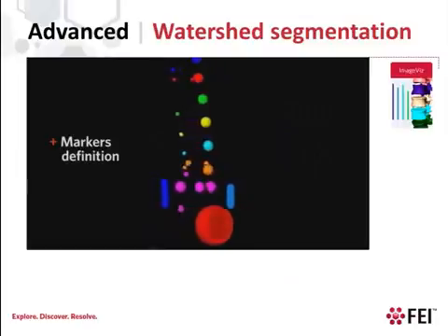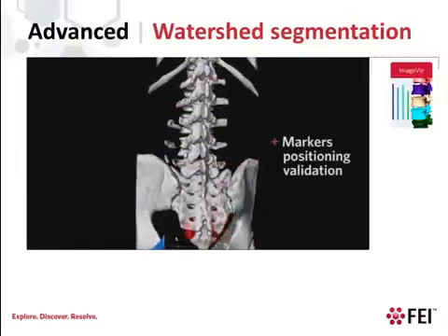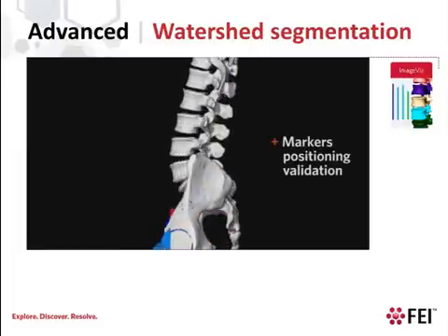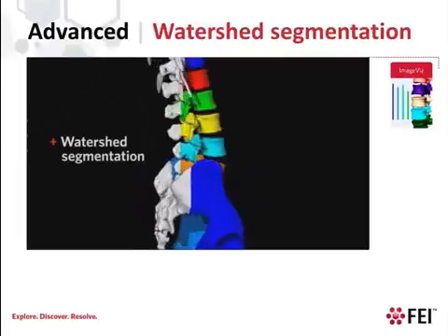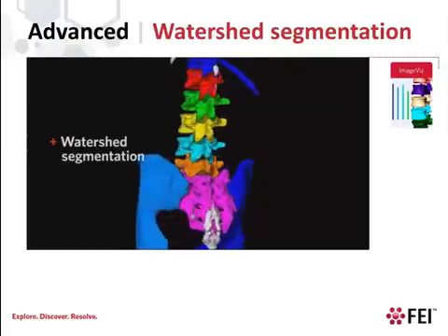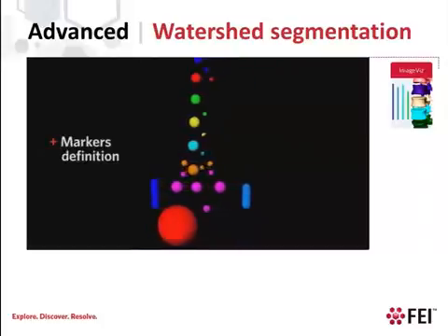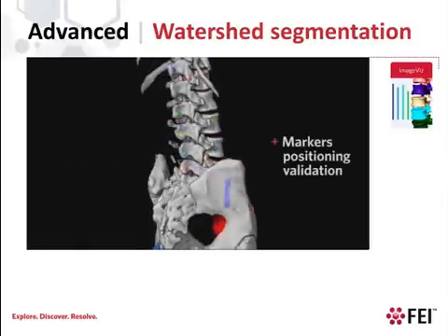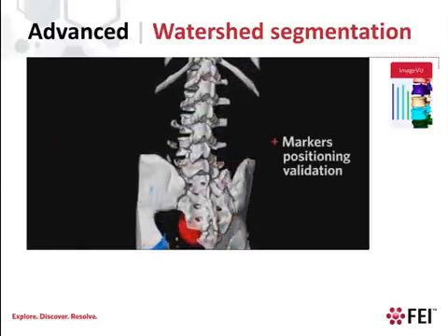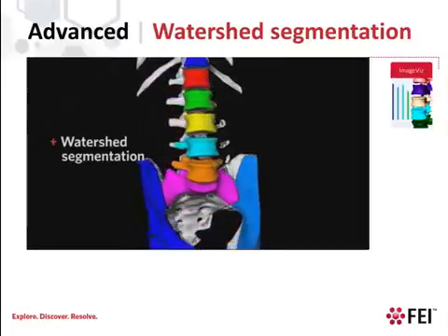Here we'll use the new Image Viz extension to algorithmically segment each vertebra of a spine. This is video of the actual program running, but we've edited out some of the less interesting steps. We have two inputs, the original dataset, a stack of images, and a set of markers that we created in a second volume. In most cases, spines are similar for similar-sized subjects, so we could load a set of predefined markers and adjust their position by hand or automatically.